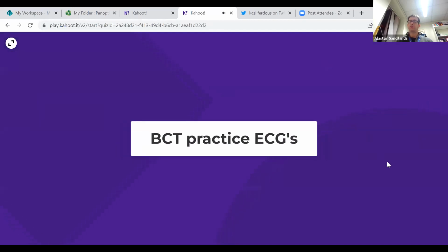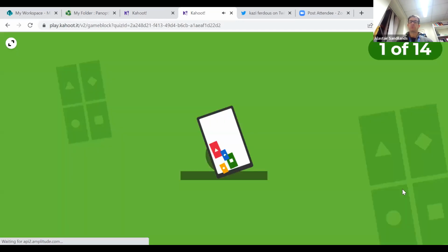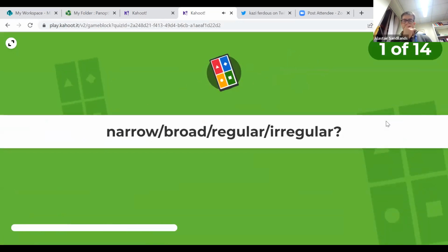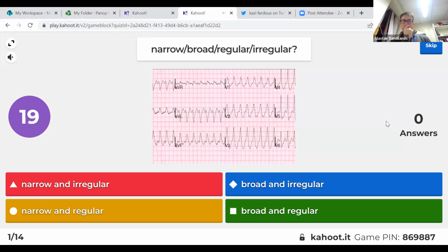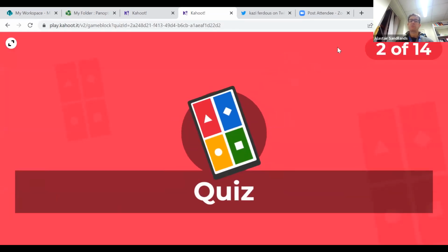Questions 1 to 4. Excellent. Yeah. So broad complex tachycardia, a regular rhythm. Very good. So you're trying to go down the algorithm to have a look. Well done. Question 2.